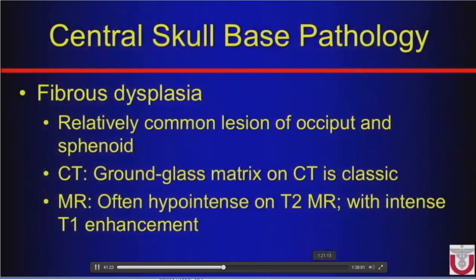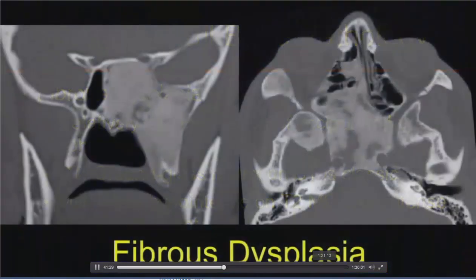So, other pathology we have. You heard about fibrous dysplasia. Here we're looking for that expansile change to the bone and the ground glass that's around it. So here's another case, as you saw earlier. And here's rotundum and vidian that we saw. And here we see they're very narrowed. We see that ground glass and expansile changes. So we can have fibroosseous lesions of the skull base.